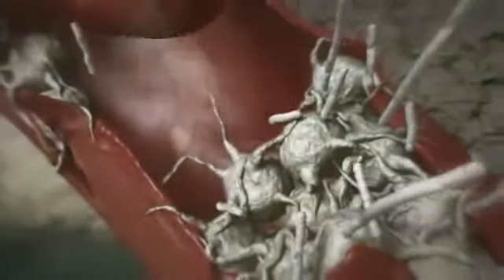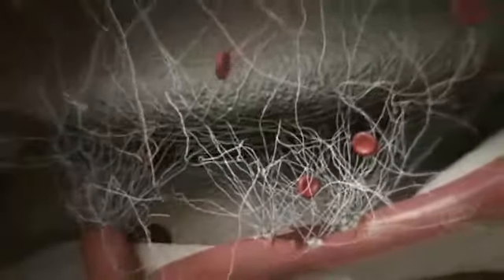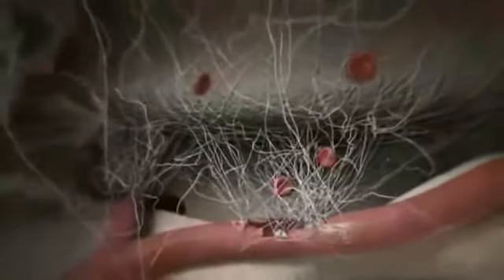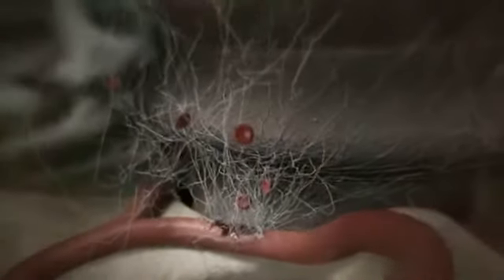Fibrin monomers spontaneously cross-link, forming a fibrin network. The blood clot permeates the wound space, forming a provisional matrix. It also adheres to the implant surface. This blood clot has tremendous importance as a provisional matrix for subsequent bone healing processes on the implant surface.